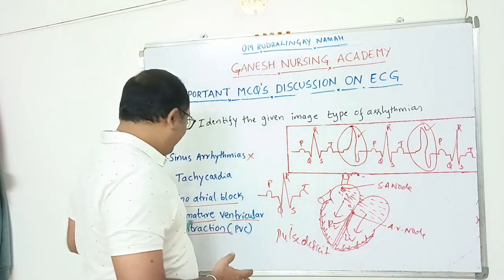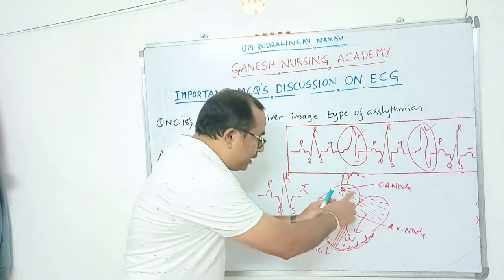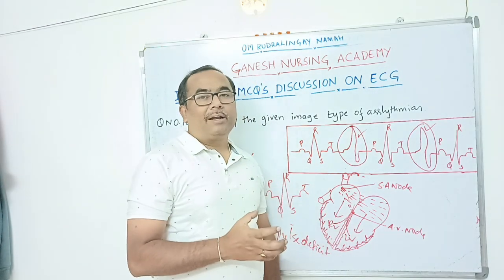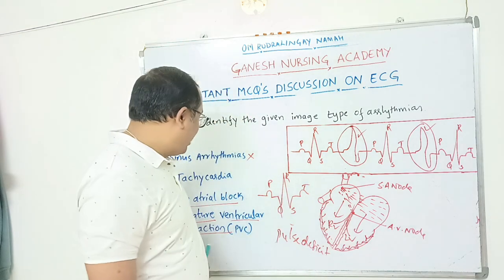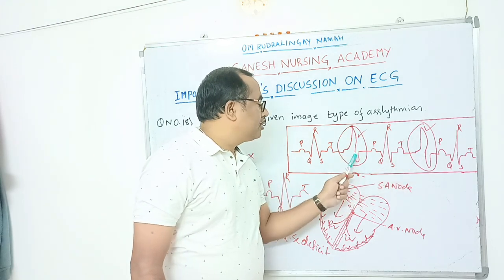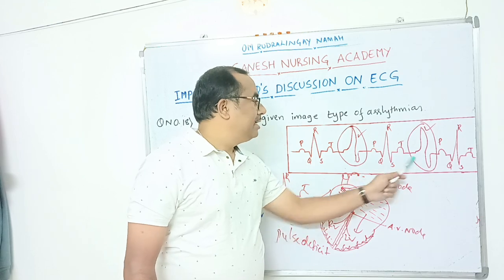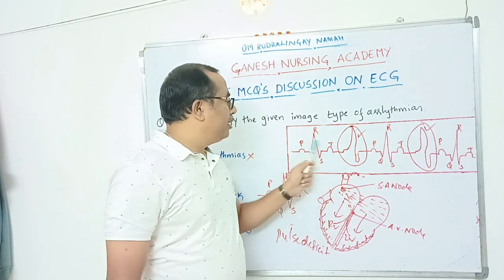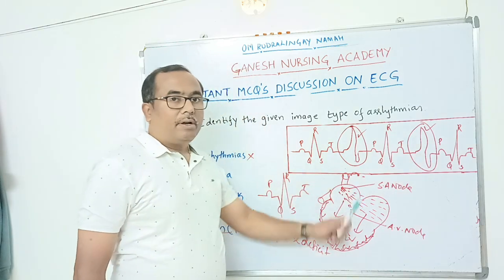The name itself, premature ventricular contraction, says that before the two ventricles are completely filled with blood, there is a premature, weak contraction of a ventricle. This kind of ectopic shows a broad QRS complex and an inverted T wave. We can see these premature ectopics between the normal PQRS complexes, in the normal rhythm. This is known as a premature ventricular contraction.